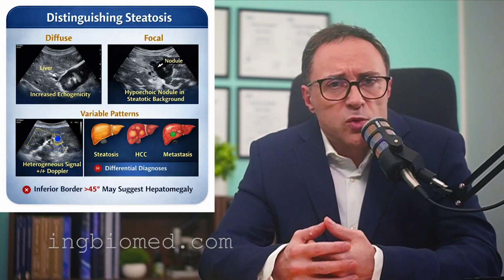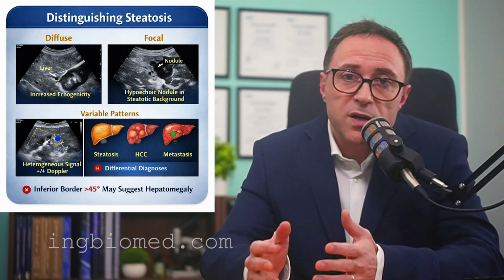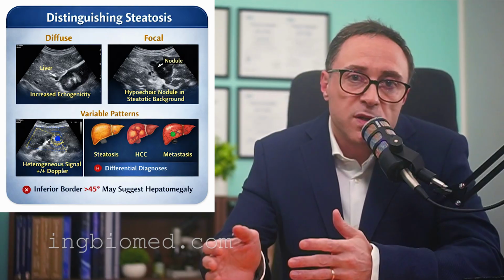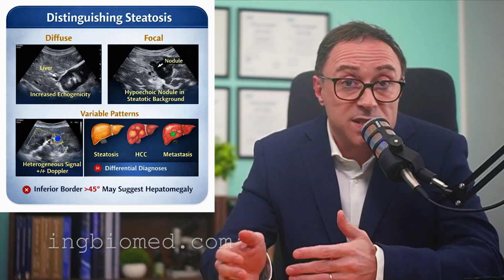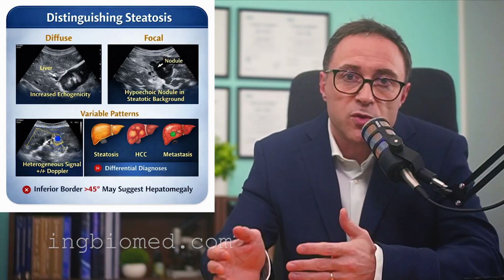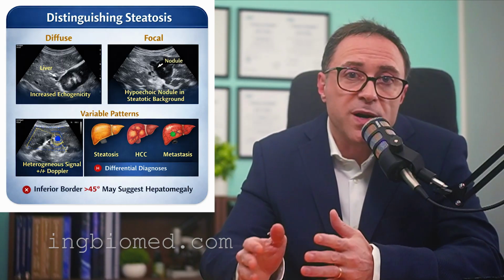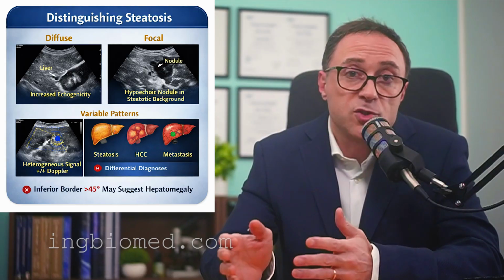It is important to recognize that steatosis may also present in focal or multifocal patterns, which can mimic metastasis. In such cases, the absence of vascular distortion and the typical distribution patterns help guide differential diagnosis.